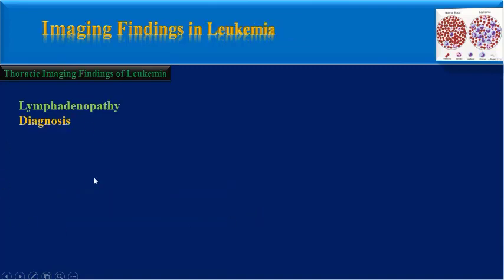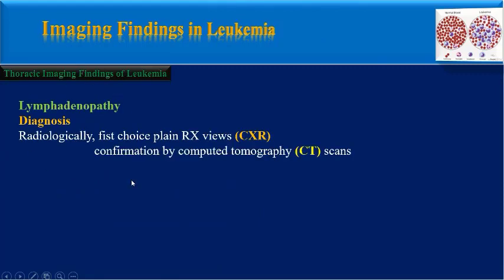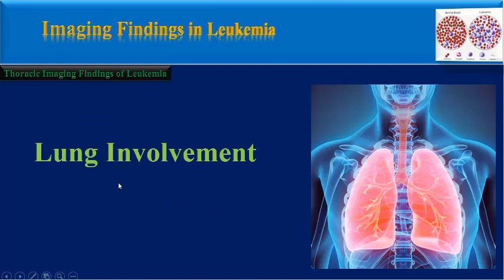For diagnosis of lymphadenopathy, the first choice is chest X-ray, and confirmation must be done by CT scan. The differential diagnosis, of course, is lymphoma. The next segment is lung involvement.